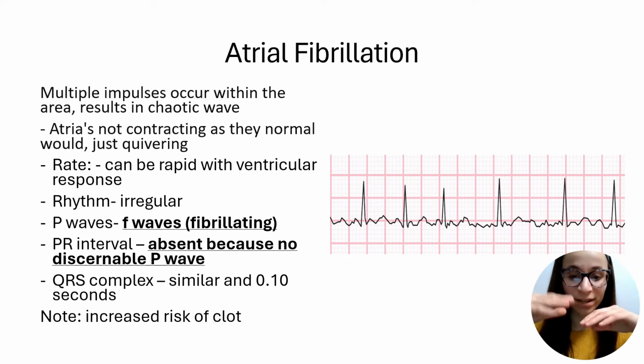But regardless, in terms of what you're going to see on an EKG, you're going to see these small F waves, fibrillating. So it's not going to be sawtooth like the other one, the flutter, atrial flutter. It's going to be a little fibrillating.